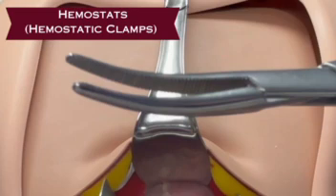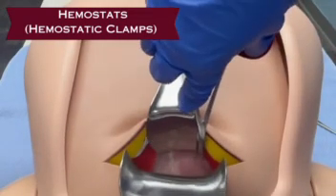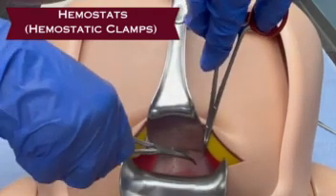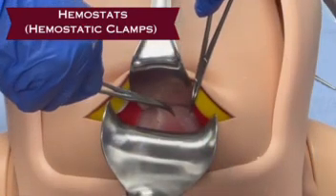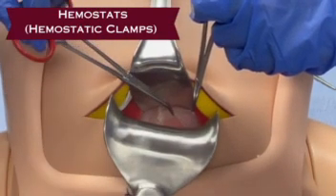Hemostatic clamps, or hemostats, also commonly referred to as snaps, mosquitoes, or tags, can be either straight or curved. Hemostats have slender but serrated jaws that allow for a strong, atraumatic grip on delicate tissue or smaller and finer structures. Uses of hemostats include grasping or securing small amounts of tissue or vessels, tagging or marking suture during a case, and are also often used to secure the surgical drape or cords or tubing prior to surgery.